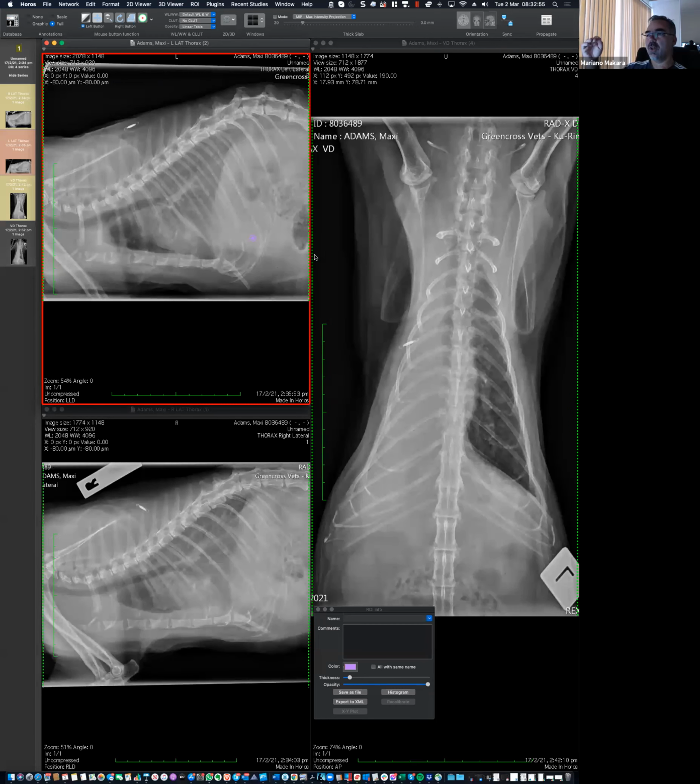Good option. So, you're going to hate me, but I'm going to put myself in the position of trying to find issues with your ideas, okay? But that's the way to select the right idea. The issue with the idea of the torsion, even though it's a beautiful one, is that usually it's one lung lobe. It's not the whole, I mean, all the lobes.